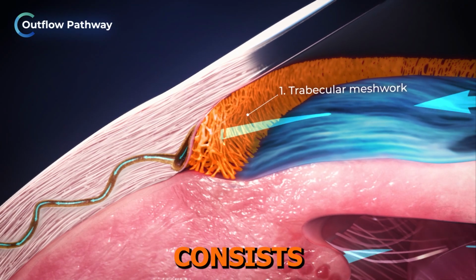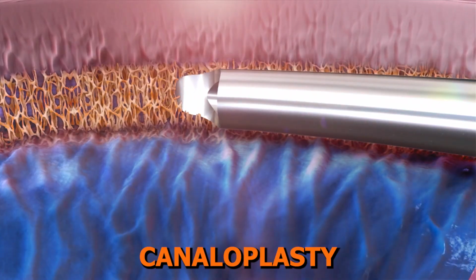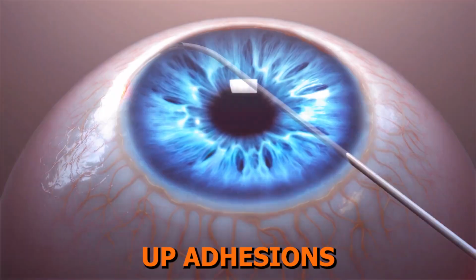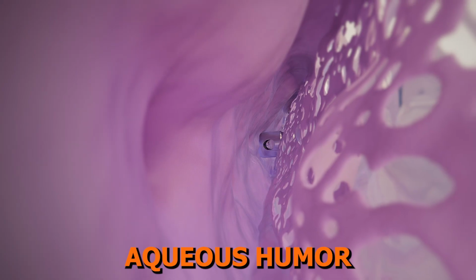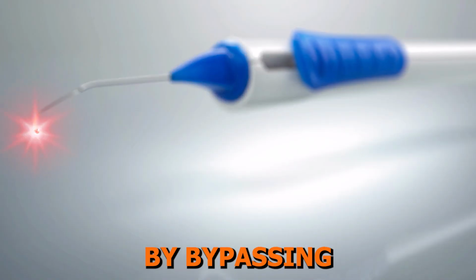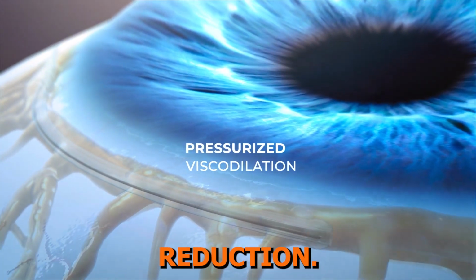Lesson 2. Mechanism of action. The outflow system consists of the trabecular meshwork, Schlemm's canal, and the collector channels. Canaloplasty targets Schlemm's canal by dilating the canal circumferentially up to 360 degrees and breaking up adhesions that can develop. It reduces outflow resistance, allowing the aqueous humor to flow more freely into the collector channels and episcleral veins, while avoiding bleb creation. By bypassing resistance, canaloplasty effectively lowers intraocular pressure.